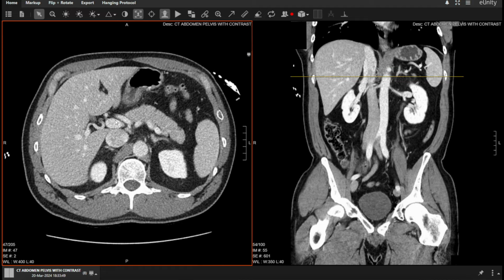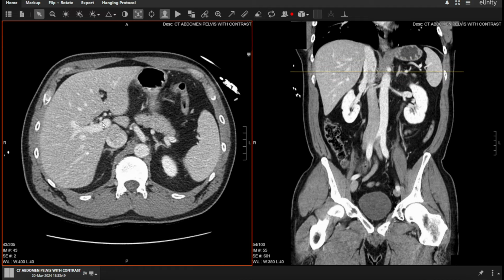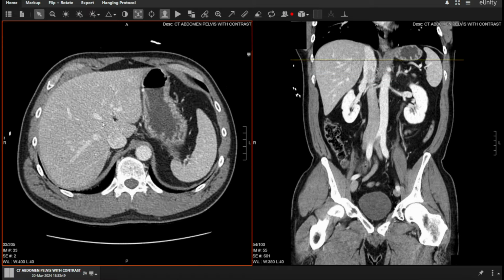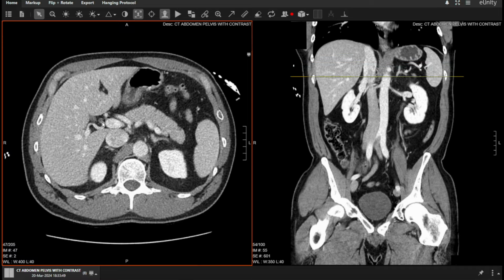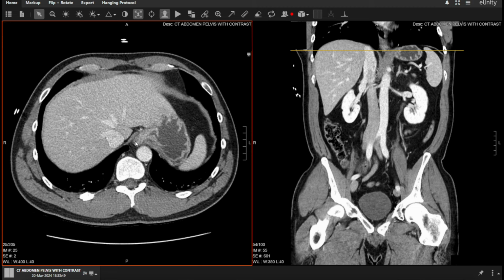Splenic to make the portal vein. Now, fair warning, the gastrointestinal anatomy can be a bit more difficult to sort out. We'll start up top here. The esophagus dumps into the stomach.